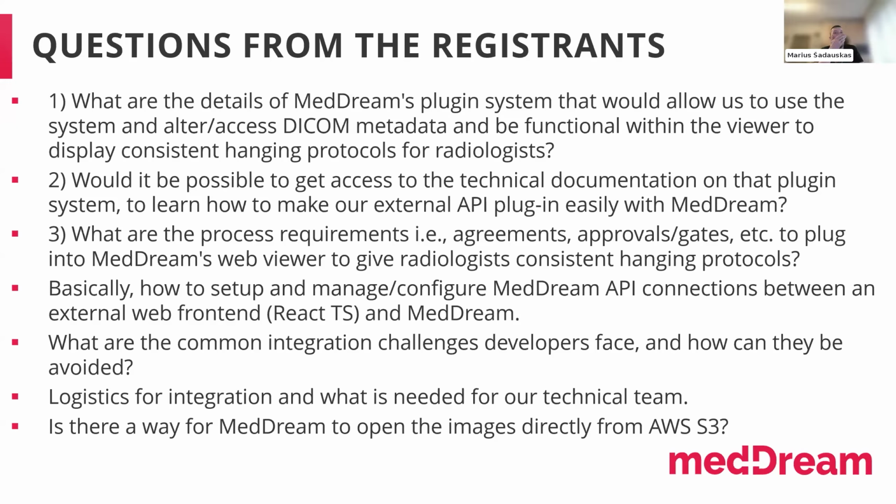Yeah. So for this, MedDream Viewer has hanging protocols, and you can use our hanging protocols, which in principle take the study metadata and apply the correct hanging protocol. But as you saw from our demo, it is also possible to get this metadata information about each viewport, each series, each instance, and so on.